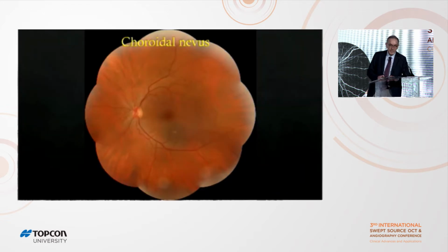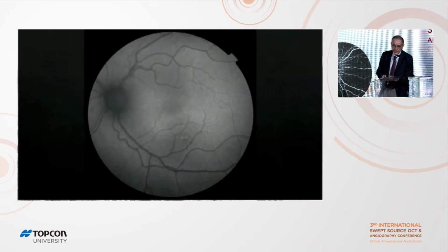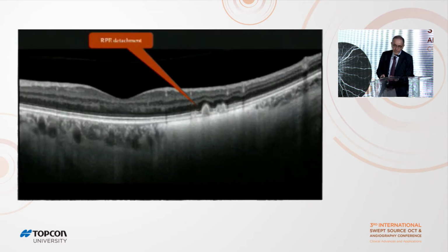So this is another patient with, again, choroidal nevus. This is the left eye, and this patient had this lesion along the inferotemporal arcade. As you can see here, there are lots of drusen on the lesion surface. And this is the fundus autofluorescence image showing tiny pinpoint hyperfluorescence on the lesion. And this is the Swept Source OCT image. Basically, it shows the same features as discussed in the previous patient. But this patient also has drusenoid retinal pigment epithelial detachments, which also is a sign of chronicity.